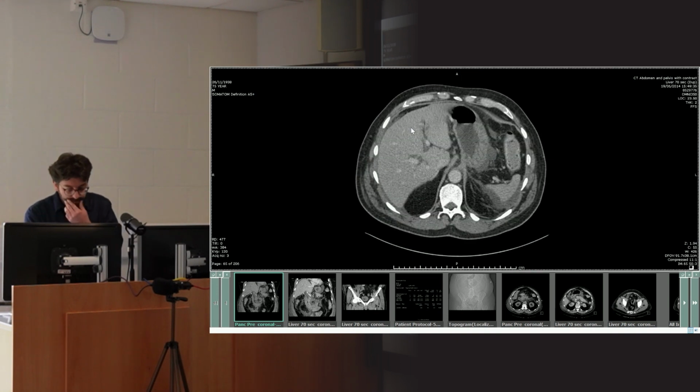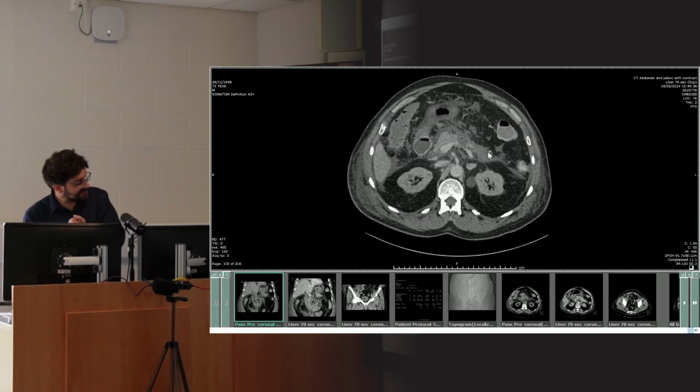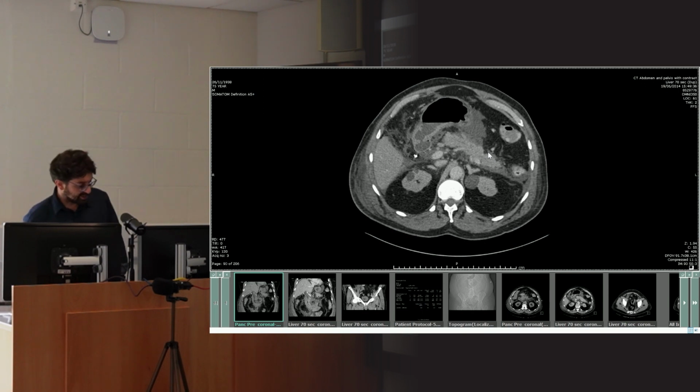So are we happy just calling this acute pancreatitis? Finishing the report there and ending? Well, no, as I've gone through, it's a job of radiologists to go that extra mile. So with pancreatitis, one of the important things is, are we dealing with necrotizing or non-necrotizing pancreatitis?